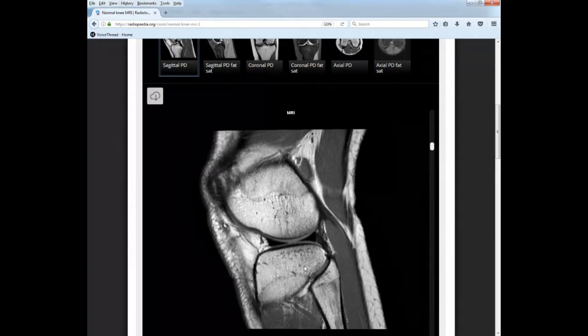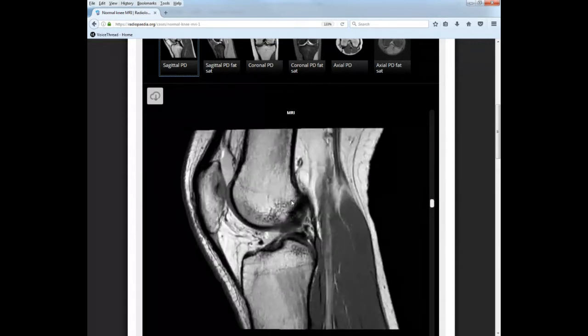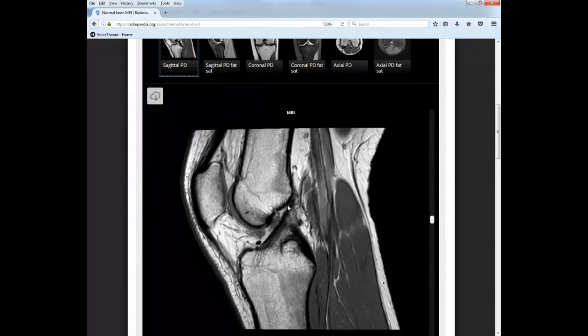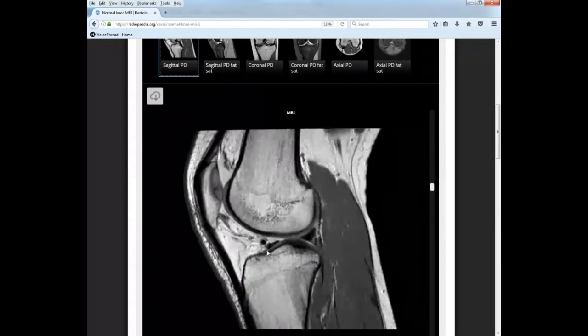Next thing we have to talk about is the meniscus. So since we're in a sagittal plane, I wanted to point out that the meniscus, remember, these are two C-shaped discs. So the two C's are pointing together from lateral to medial. So the two horns, remember, anterior and posterior horns of your menisci face together, and they're connected on the anterior horns by the transverse ligament.